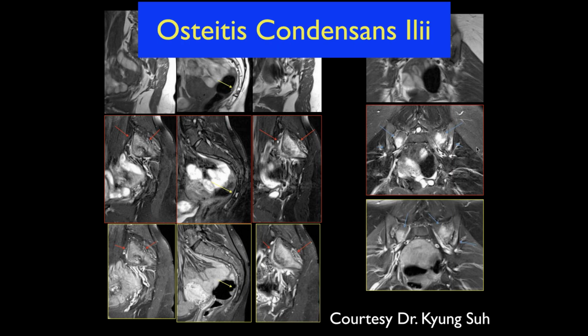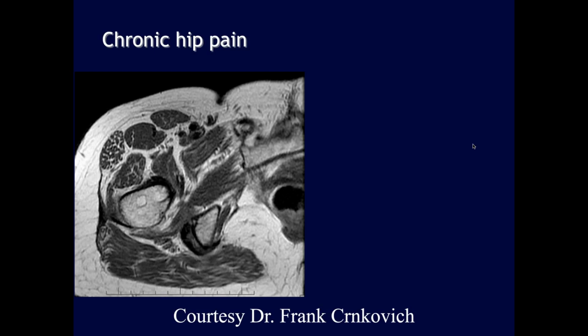Yeah. But this was... And in women, it's pretty rare. Yeah. So this was thought to be osteitis condensans ilii secondary to birth trauma of the sacroiliac joints. The rest of the workup was negative in that patient.